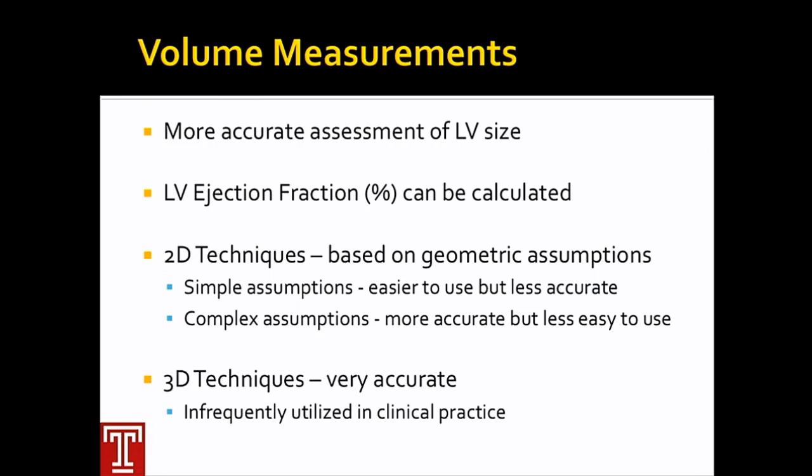So volume assessment in the left ventricle has definitely come a long way since 1992 in my introduction to echo. We can use 3D techniques. I'll show you an example of that in a minute or two. They are very accurate when compared to cardiac MRI and other techniques. They are still relatively infrequently used in regular clinical practice.